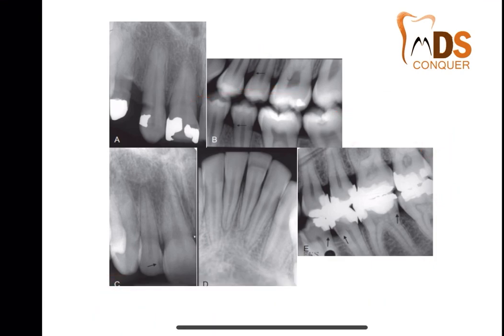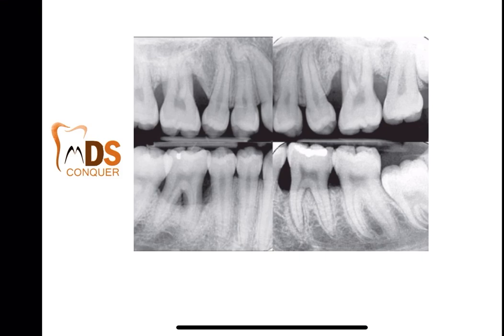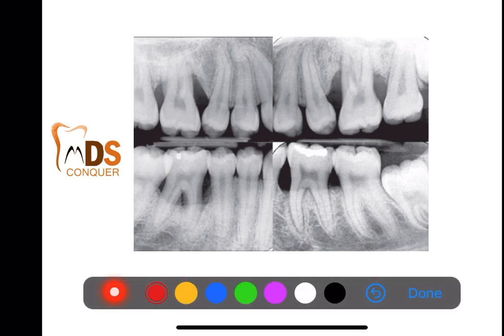So that is regarding dental caries. Next, coming to the periodontal lesion, which is aggressive periodontitis. If you see this picture, a radiograph is given to you. How will you know whether it's aggressive periodontitis? Because there is bone loss, a defect seen only at the molars, right? In aggressive periodontitis, usually the anteriors and molars are involved, whereas premolars are normal.